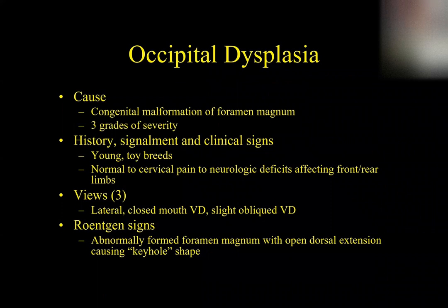So if I was to ask you on a quiz coming up, are radiographs a really good and sensitive way to diagnose hydrocephalus? And you would say, hell no. Okay, it's a piss poor way. The real way is with CT or ultrasound or with MRI. However, sometimes you get lucky, right? Not often, but sometimes you'll get a hint of hydrocephalus based on plain films.